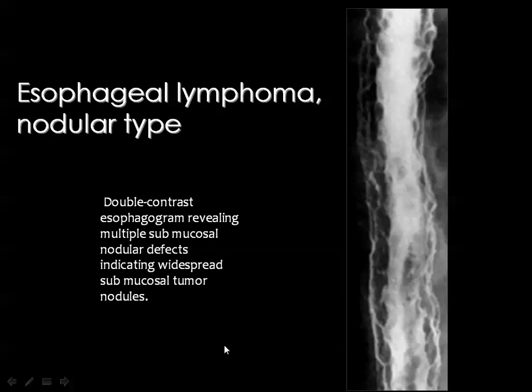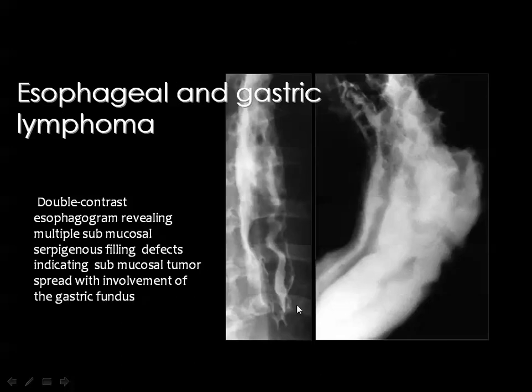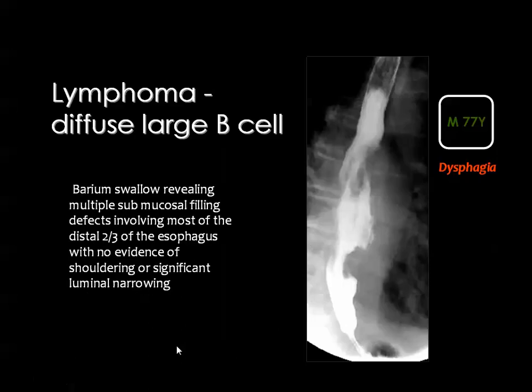Then esophageal lymphoma. One of the patterns of lymphoma in the whole gastrointestinal tract is the diffuse mucosal thickening to a significant degree like this. And this is the esophagus, and you see that the mucosa is markedly thickened, and it does not usually produce obstructive changes, especially in the esophagus, but you may predict the lesion by this. You can see huge thickening of the mucosa, and this may also extend into the stomach in a combined lesion affecting the esophagus and the stomach as well.